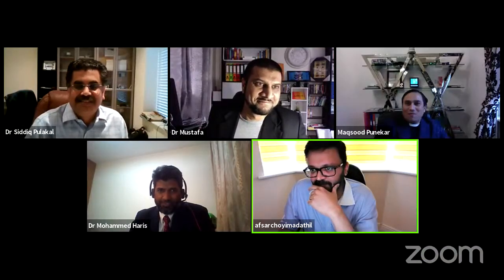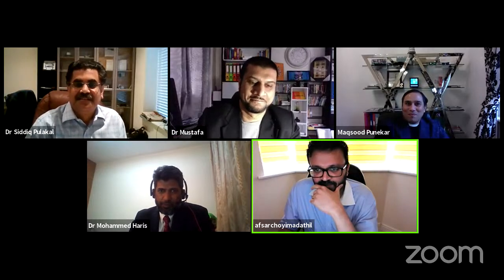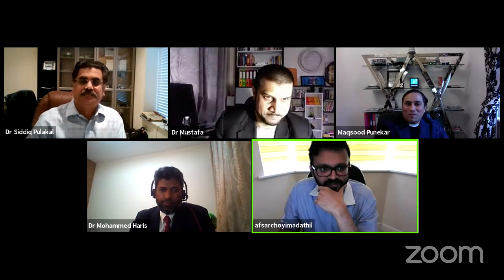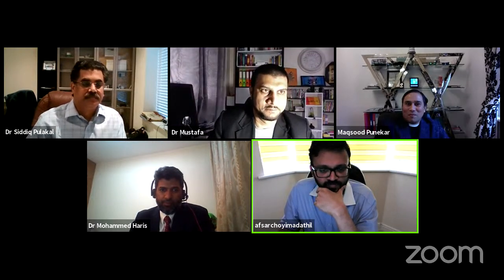Now, you mentioned that chest X-ray reading has to be personalized. Would you mind sharing your personalized way, that secret, and we'll decide whether we should follow that or not? Yeah, right. Okay. So I'll do one thing. I'll straight away pick one X-ray which is open in front of me.